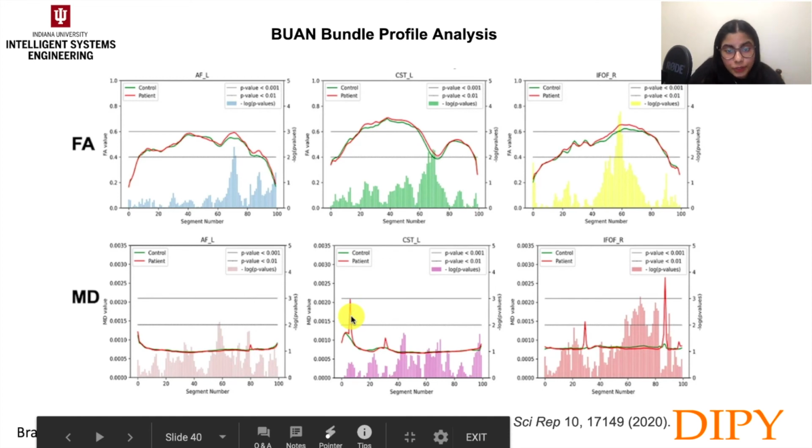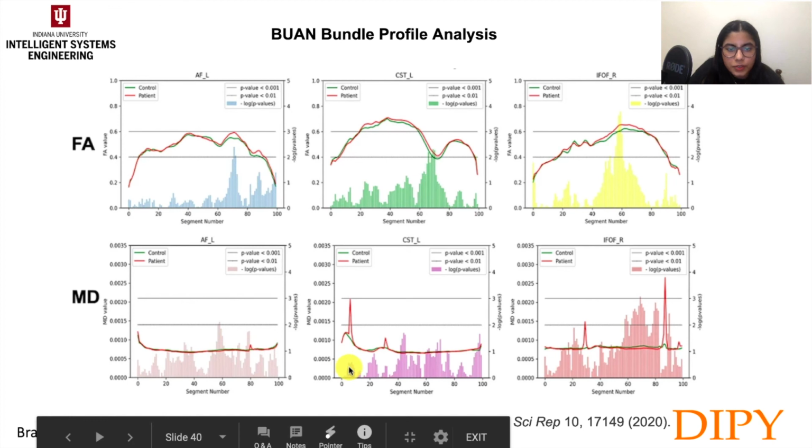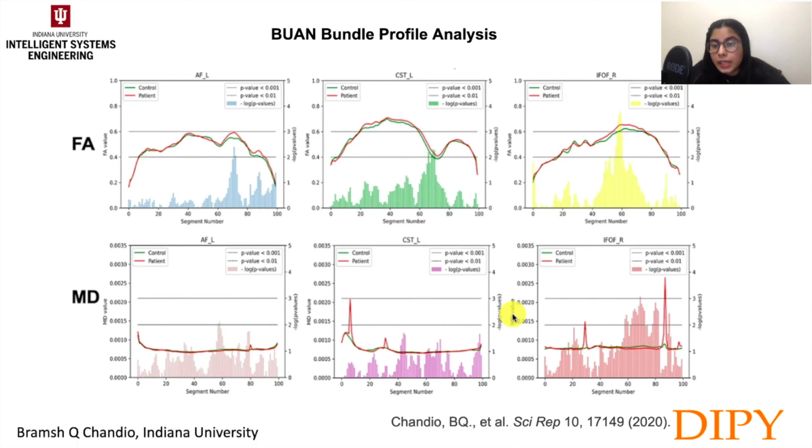But if you look closely, linear mixed models is not giving it any higher significant p-value. We don't say that this area comes under the significant group difference. This kind of proves that linear mixed models is working well and it could deal with outliers.